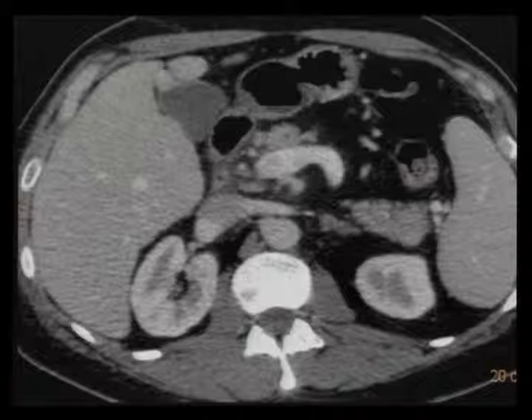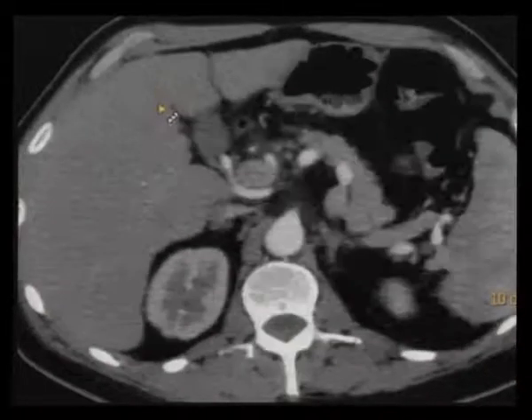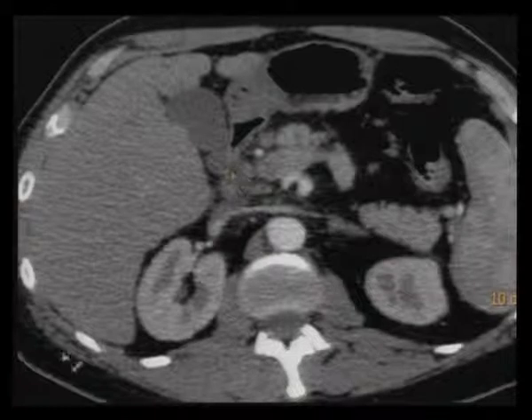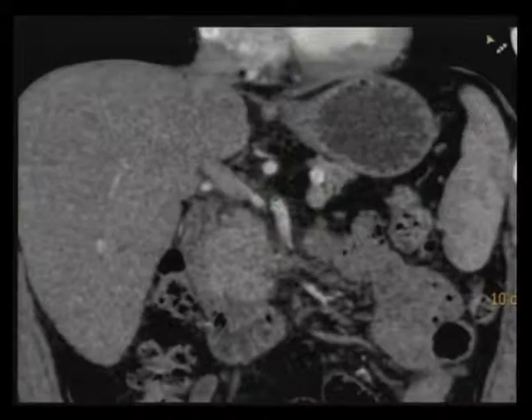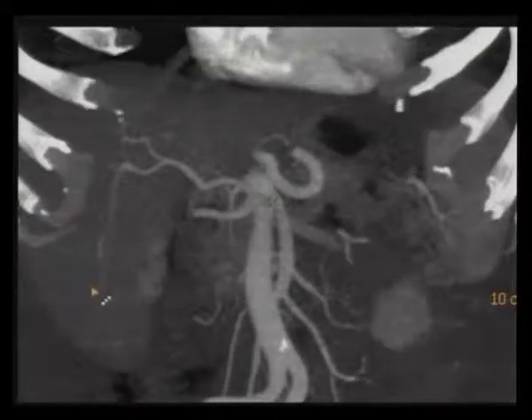It's very easy to obtain something like an angiographic view. Again, this is an arterial phase, you see. The arteries are emphasized in this phase. And this is the trunk. Again, we can rotate it. This is the ROI of interest. And this is what we can obtain, something like an angiographic phase.